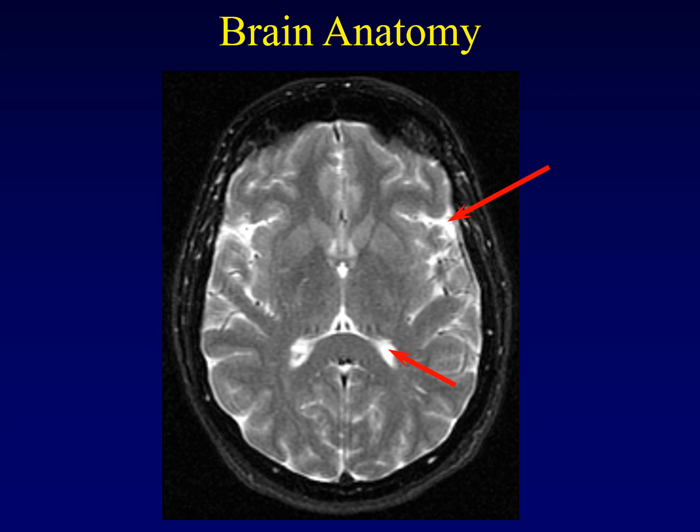Well, on a T2 weighted image, the CSF is bright, the water is bright, and that is CSF. Here it is in the atrium of the lateral ventricle, and here it is at the opening of the Sylvian fissure coming back. Right? CSF.